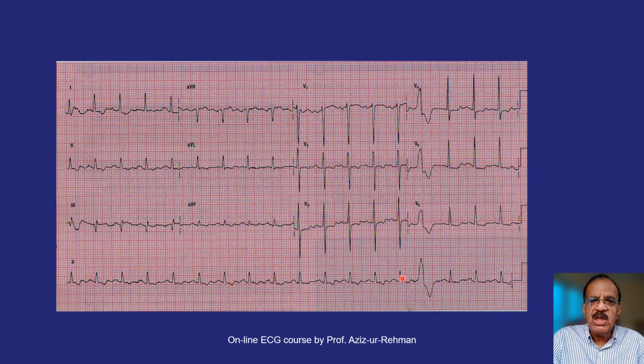And since these leads are recorded simultaneously, the same electrical phenomenon recorded here is depicted in these leads also. So there is just one ectopic activity which is shown in all leads. So this is what should draw your attention.